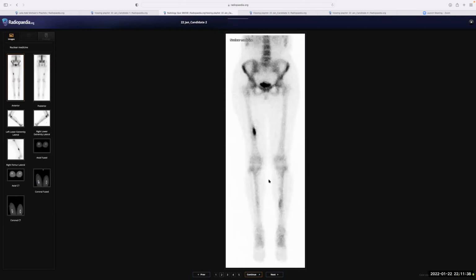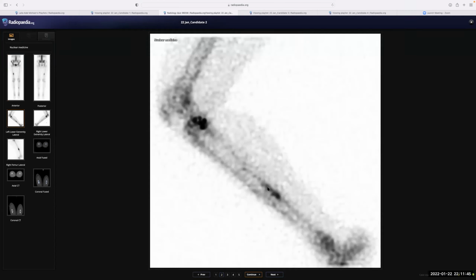But the nuclear scan, you were right. These are straightforward for the stress fractures, being linear along the bone and so on. And also focal, they don't take a long segment of the bone, just focal uptake. Right.